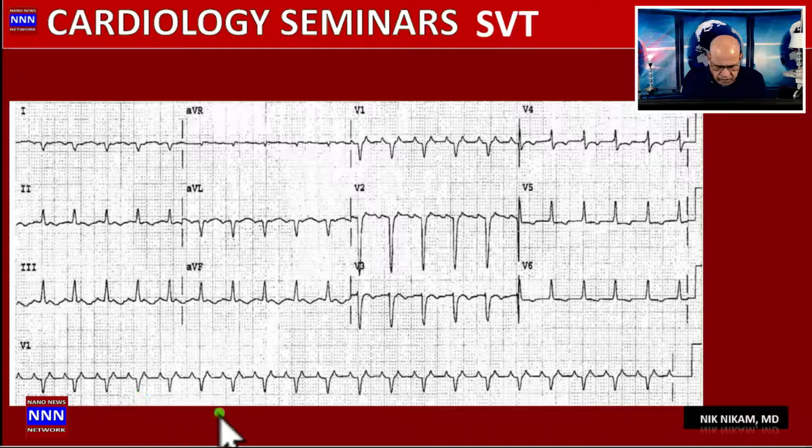This looks like a fairly regular tachycardia. The RR interval, if it's 3 boxes here, it is 100. It is more than 3 boxes, it's like 110, 120. So when you're looking at 120, you multiply that by 2, that's 240. So then we are looking at maybe an atrial rate of 240 to 250, and we can see some clear distinct P waves here. So this is a case of atrial flutter with 2-to-1 conduction. We also see a shift in the axis here. Lead 1 and aVL are negative, and we also have loss of R waves anteriorly along with the atrial flutter with 2-to-1 conduction.